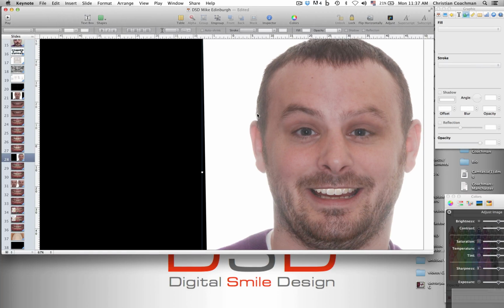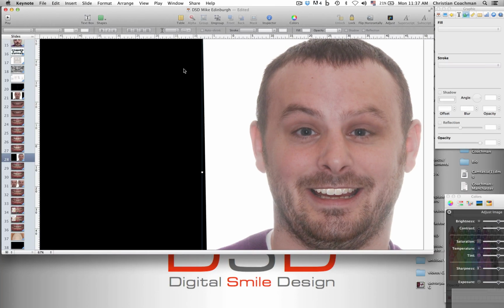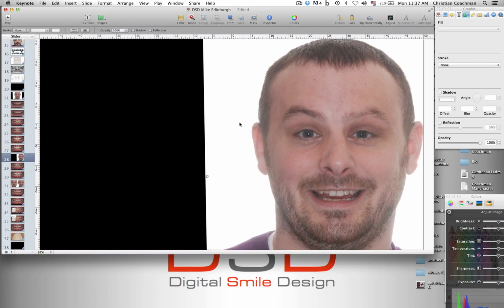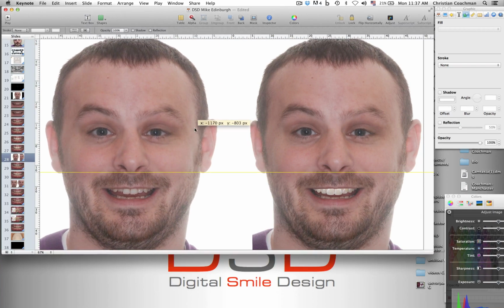Now I click on the picture and I duplicate the picture. So now, oops, I'm sorry. I can ungroup them. Okay, ungroup them. And if I click on the picture, I duplicate the picture and I have the pre-op. Before and after.